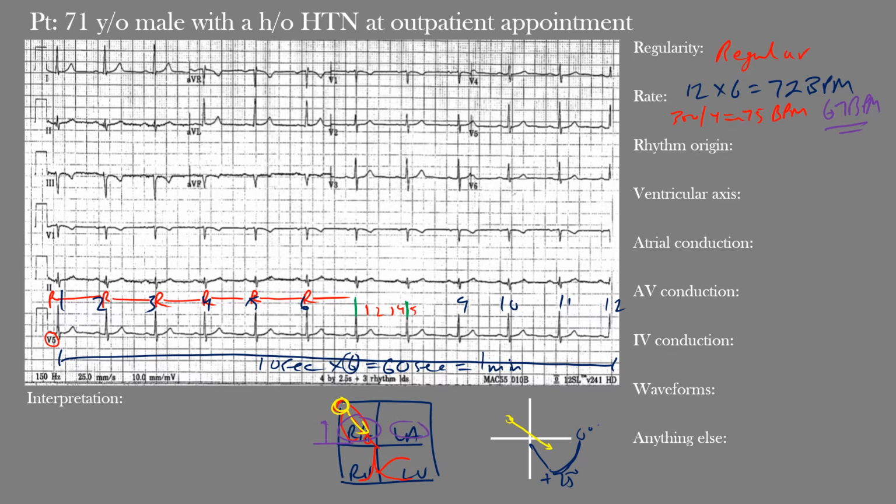Okay, so remember the leads would be 1, right? We have lead 2 here at positive 60 degrees, so somewhere around there. When we have lead AVF down here, another inferior lead, we have V4, V5, V6. You may also hear of AVR, which is placed here. AVR is going to see inverted P waves because the impulse is moving away from it. Now negative AVR would be here. That's simply the inverse of AVR, where we'd see a positive, but that's not on the standard EKG. So what we're saying is we want to see upright P waves in lead 1, lead 2, in V4, V5, V6, and then possibly in AVF, and we want them inverted in AVR.